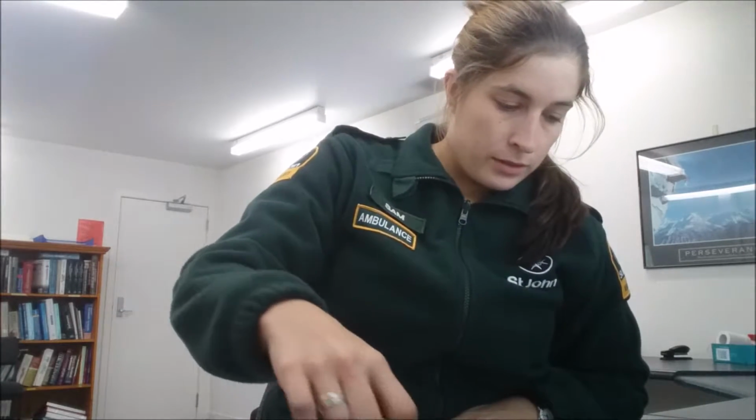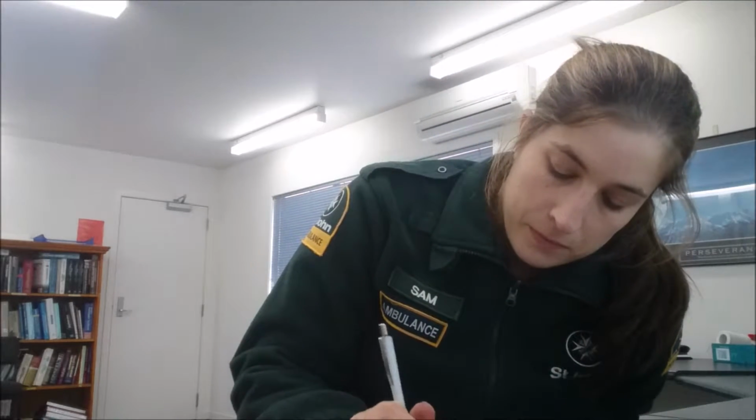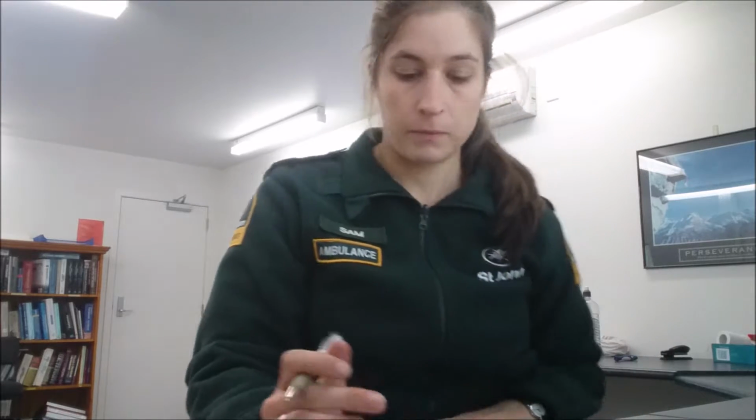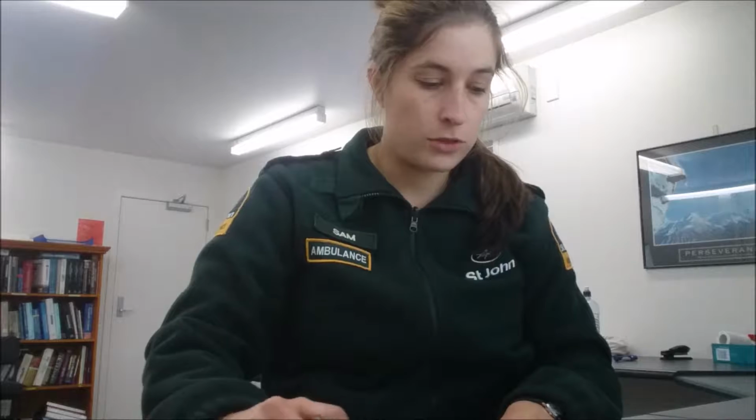So your case is a 32-year-old female, seizure, postictal on your arrival. Has a history of epilepsy, which is well controlled via medication, nil injuries. That's all you've got. No other vitals or anything. No vitals, no. Okay, so let's just do the general impression.